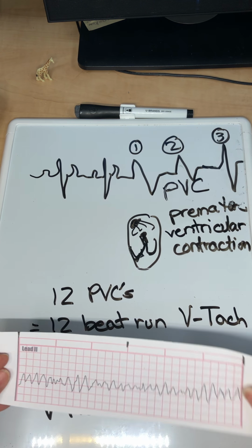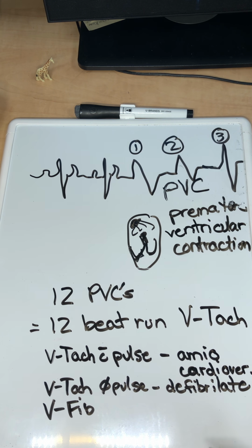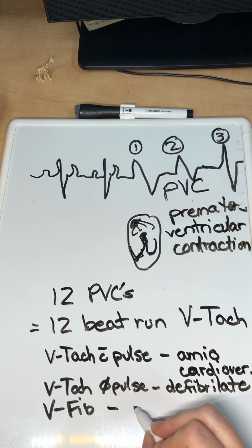One more look at it. Squiggly line, that's bad. That's VFib. You're going to defibrillate.